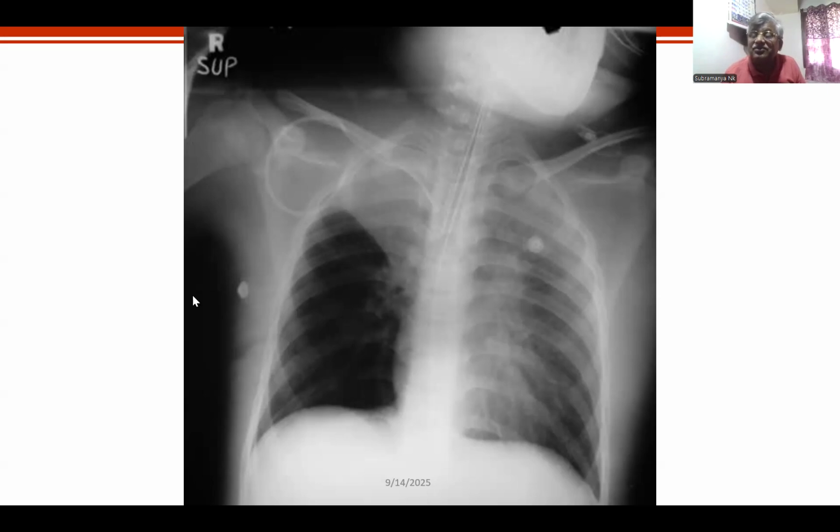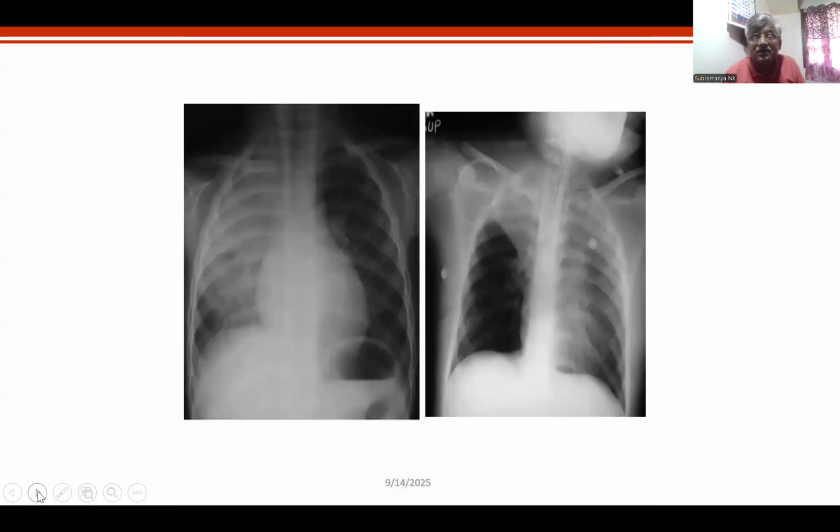And how did you say it is collapse? That's very, very important for me. I'll show you both the X-rays now. Now look at why this is a collapse. First of all, in collapse, there is a reduced volume. You can see the reduction of the volume. Why not say? I'll come to that point. There's reduction in the volume.